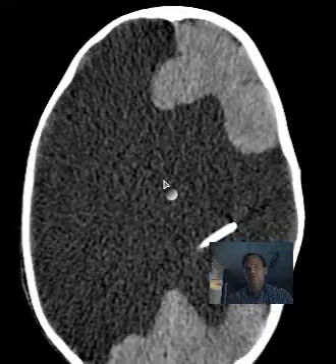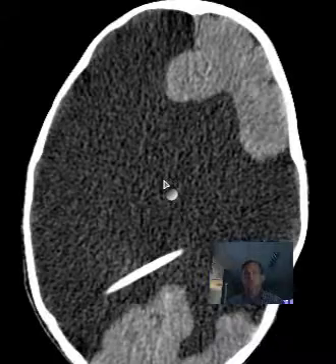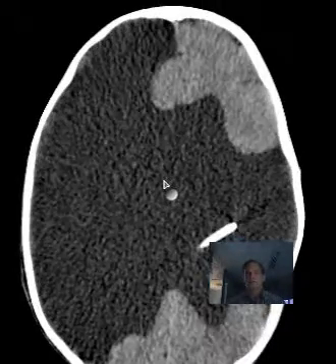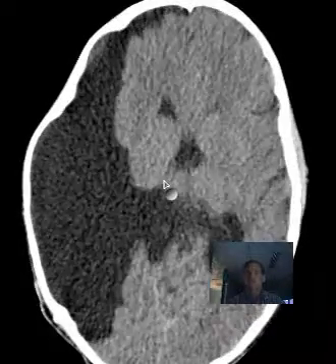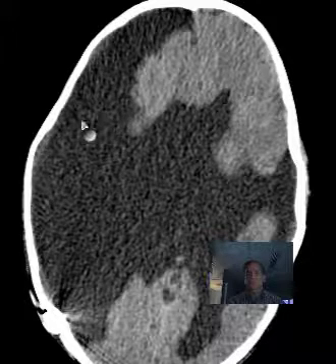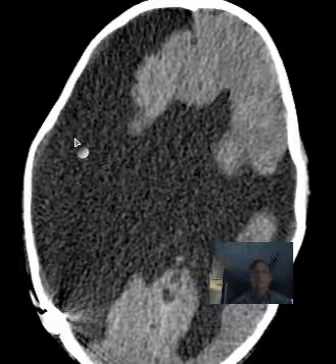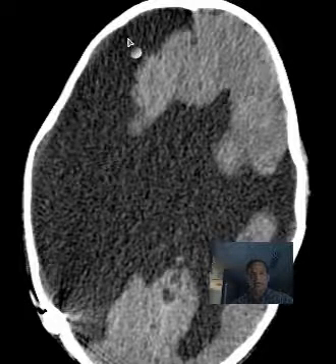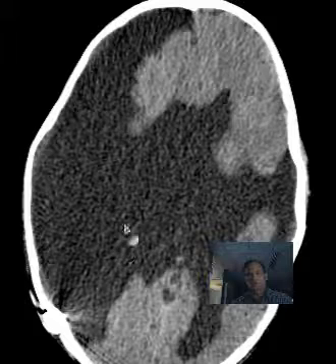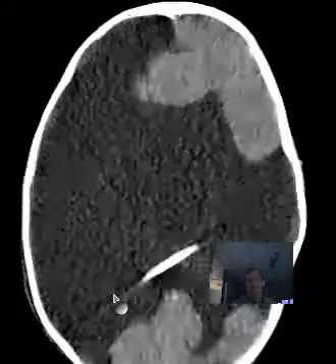So this could reflect infarcts, but another common problem, especially in premature infants, is periventricular hemorrhage or intraventricular hemorrhage, which extends out for various reasons into the hemispheres adjacent to the lateral ventricles and can cause a great deal of encephalomalacia there. Sometimes it's a combination of findings, including hemorrhage with infarction, and those findings lead to this, in some cases, very prominent loss of substance of the brain.